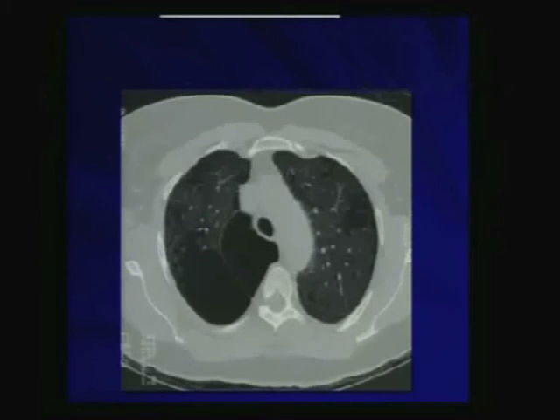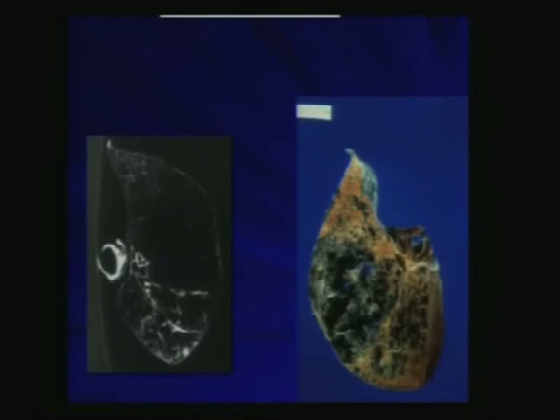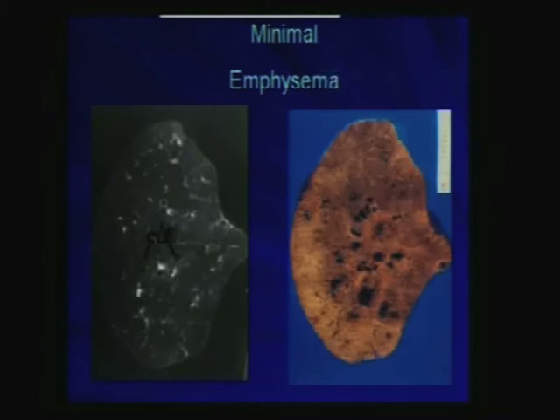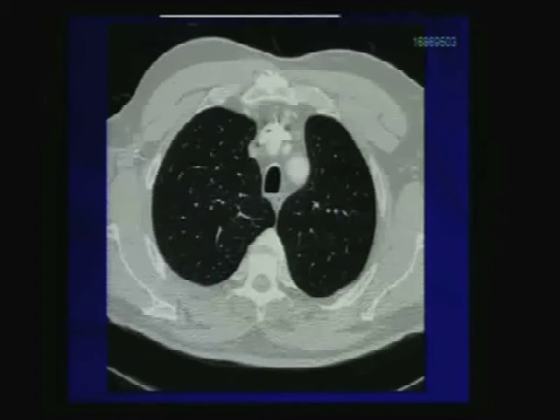And then obviously these areas of centrilobular pulmonary emphysema involving the secondary pulmonary lobule can coalesce together and form large areas of bullous disease. And a specimen again showing a large advanced pulmonary disease. And this is again the time when you can make an influence on the patient, when you detect this early pulmonary emphysema.